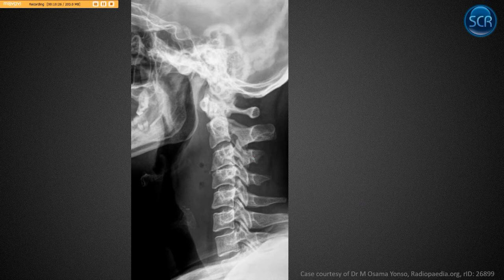Just another example of spondylodiscitis. This one's quite a bit earlier. Like I said, this one's in the early stages. They're getting loss of disc height. ADI looks normal, right? We follow George's line, right? The focal kyphotic angulation is at the level of involvement.